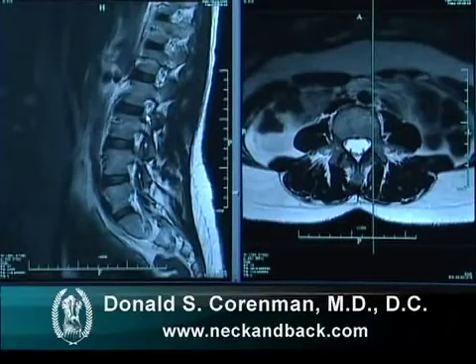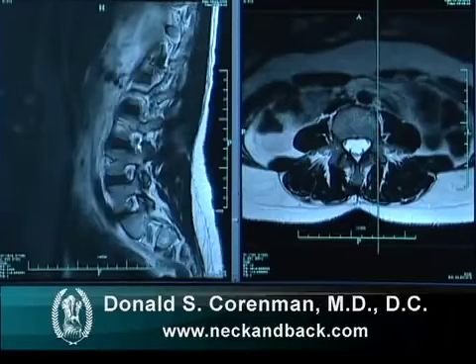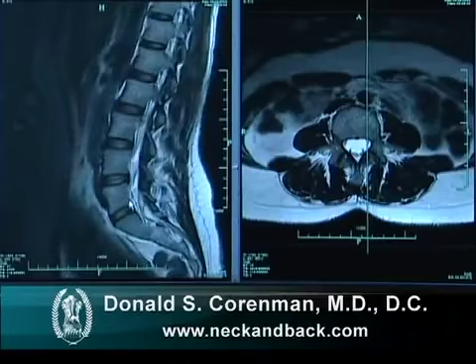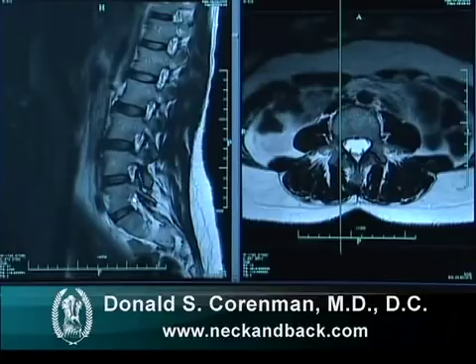In this case, this is the L2 nerve sitting in its white fat, which is nature's packing, in the L2-3 foramen. Here is the 3-4 foramen, and this is the L3 nerve right here in its fat packing. Here is the 4-5 foramen with the L4 nerve sitting in its fat packing, and the L5-S1 foramen with the L5 nerve there. We can conversely go to the opposite side and see the exact same thing, with the nerve roots exiting out the foramen.